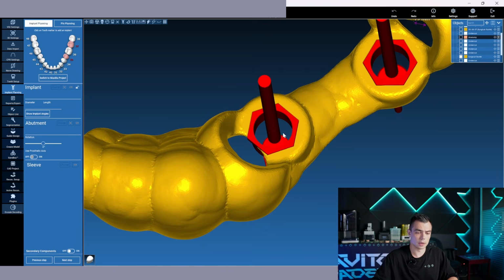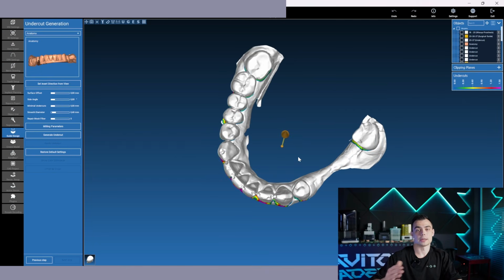While applying a rotating drill, the sleeve can just fly out of the guide, and this is quite a problem during the operation. And the last mistake, number 5, is the lack of windows.